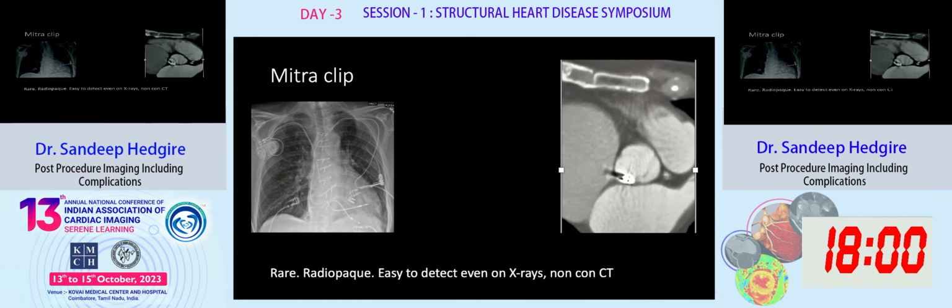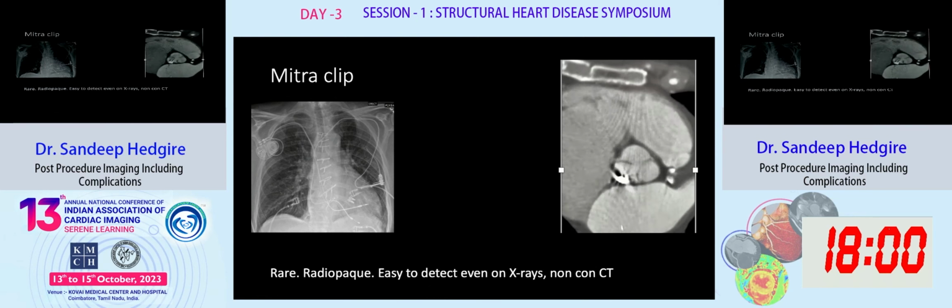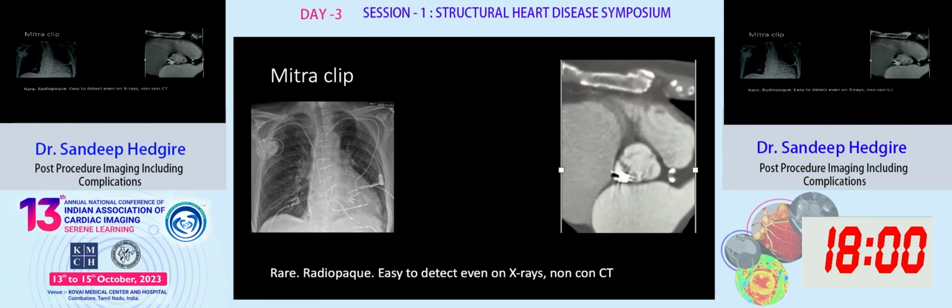Sometimes the MitraClip can migrate too. Here is an example of how the MitraClip migrated to the level of the aortic root and got stuck there.